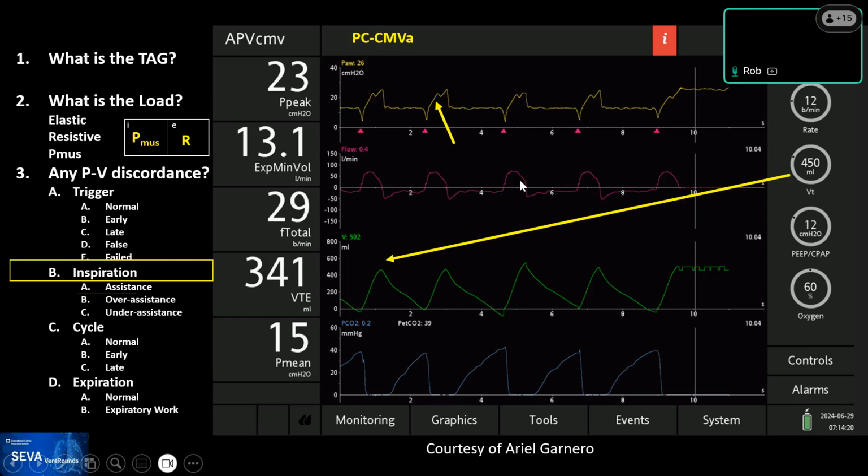You remember those first two slides that I showed, the first series of slides, and now we're going to get into this issue over here where we have an inspiratory hold maneuver. And you can tell that because this is the vertical line. We see flow drops to 0, and the plateau pressure is represented by this. And this little sign means that the screen is frozen. You can move this cursor around and see what the airway pressure is.